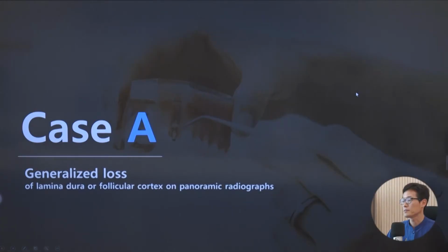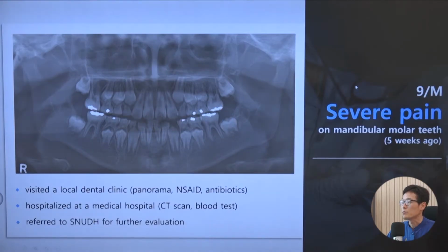Case A. A 9-year-old male complained of severe pain on mandibular molar teeth 5 weeks ago, and he visited a local dental clinic and a panoramic radiograph was taken, and NSAID and antibiotics were prescribed. He took NSAID and antibiotics, but the pain did not subside.